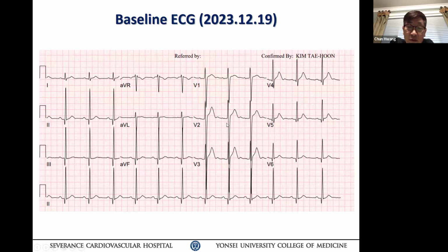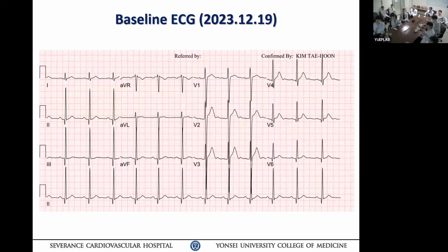맞았어? 그 다음 거 보세요. 다음 V3. V3도 가보세요. 똑같지? V4. V4 똑같아요. Okay? So you usually 3, 4 consecutive leads should be concordant axis. That's a U wave. 근데 mechanical artifact 된 환자들은 could be a biphasic, could be inverted, many other artifacts can happen. That's 그 interpretation 할 적에 하나의 trick that you can look at. Okay? Anything else? 환자 electrolyte 이런 거 다 정상이었고, I hope. 예, 예. Right? 네. Okay.